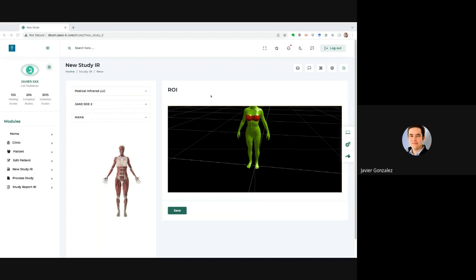So here, you select new study. You put the clinic, then the name of the patient. You can select from all the patients that you've uploaded to the platform. We're selecting Jane Doe. Well, this is just for test, right?